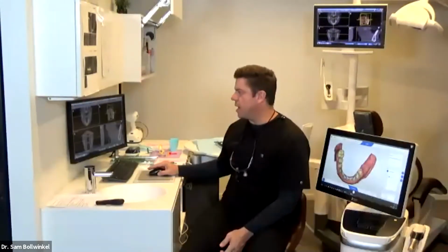How can you tell bone density in the scan? Yeah, that's a great question. As we go through the images, again, probably the easiest question on that, so we don't get too deep into it, you receive some training. There's training associated with a cone beam when you purchase a cone beam from Dentsply Sirona. That training is going to walk you through and show you very easily how you can see bone density. Especially as you look at implantology, you're removing teeth, you're looking at the bone growing back. It's amazing to be able to look at that, evaluate bone density, and be able to go, okay, let's move forward with an implant because the site's ready.